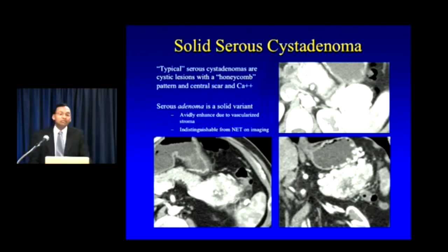This is a virtually impossible diagnosis to make on CT, and frankly, I'd say that if you read enough of these, you're ultimately going to make this mistake, right? These lesions almost always are resected. There's really no way around making this mistake.